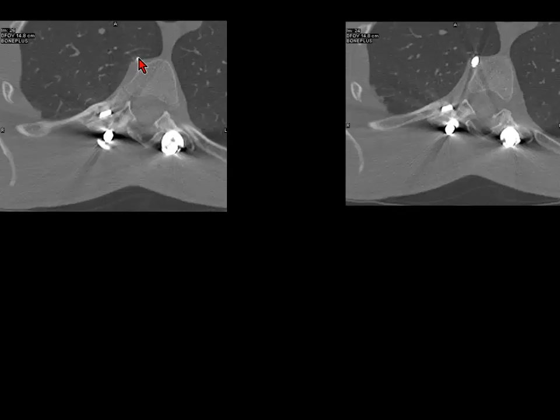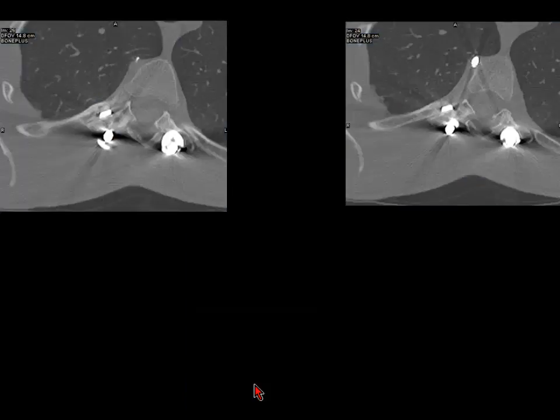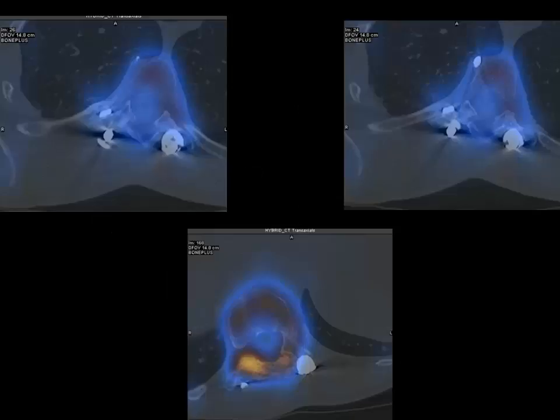And suppose it's, I don't know how he escaped pneumothorax there, but you can see this is causing the pain. So that's why it's very important how you window it, and you have to look at all, I've told you, the mediastinal, soft tissue and lung windows. So there is no abnormal uptake on this side, that is no problem with that, but there is uptake here. So if I go back, I haven't got this slide there, but probably that is the fixation, probably that's arthropathy at the facetal joint.